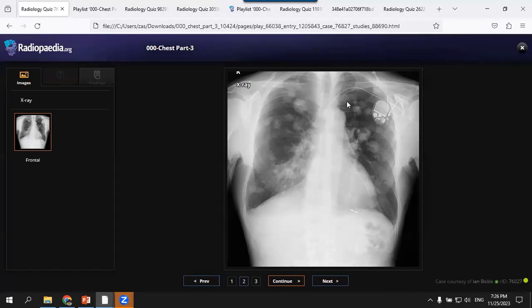So comment on the bones: no bony destruction, no surgical clips. If the patient is sick, you will see a central venous line and endotracheal tube. This is most likely septic emboli. Rheumatoid nodules are also in the differential, if there are arthritic changes here as well, but less likely in the list.